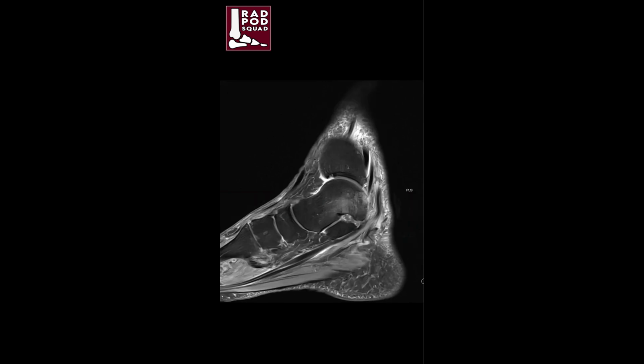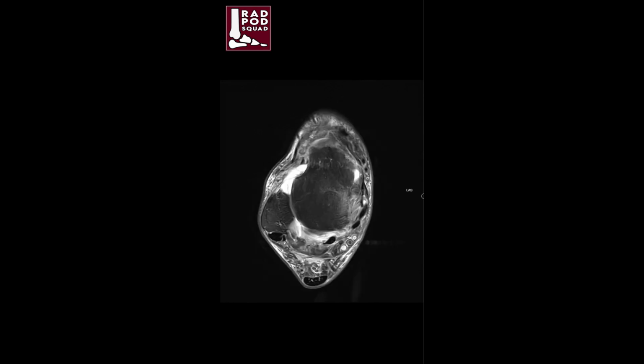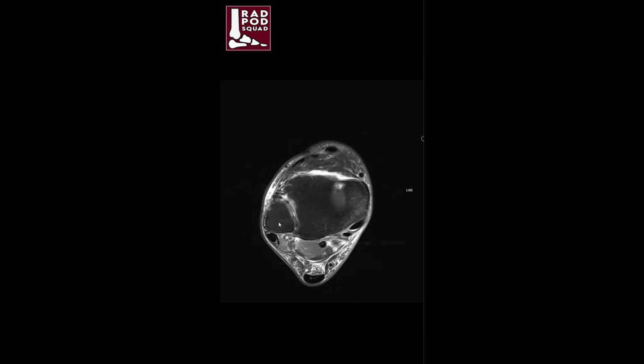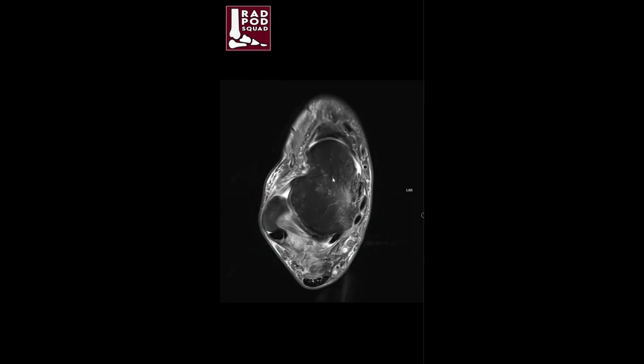In this alignment here where we are, we could see that it is more aligned. Now let's take a look at where we are in terms of the vector of the tibia and the fibula, and that match along the talar neck. So when we look at the talar head, it's not exactly rounded and articulating. There's a little bit of uncovering seen here. And when we look at the vector of the talus by bisecting the neck and then drawing a line, we get a line that would be along the lines of the first metatarsal.